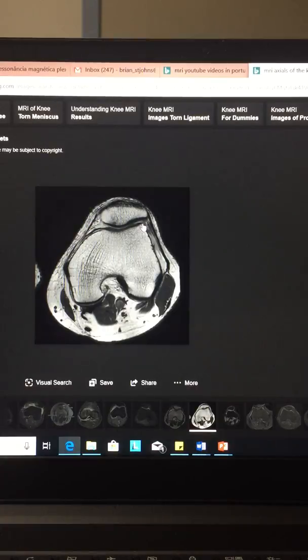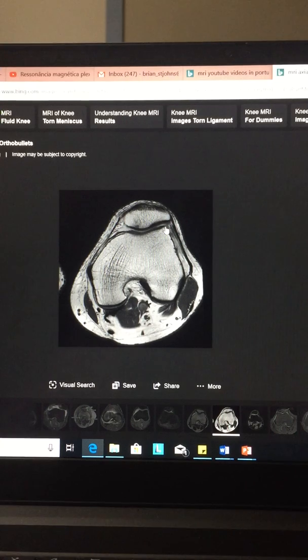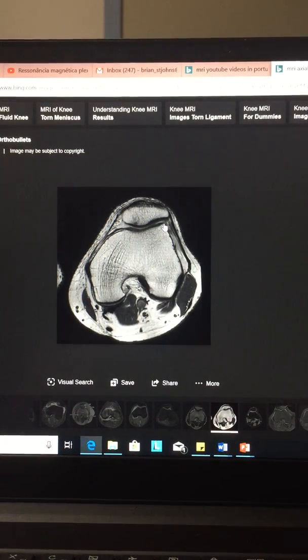Okay. Looks like this is the straight one. See, wait, is this? That's just right above the tunnel. And I think on this it just says the subpatellar cartilage. Well, we can tell where that's at here. Correct, yes. And we can tell that's where the torn ACL is. Yeah, this one, I can't see. Right. So I was just pointing out like this is. Yes. Okay. Yep.